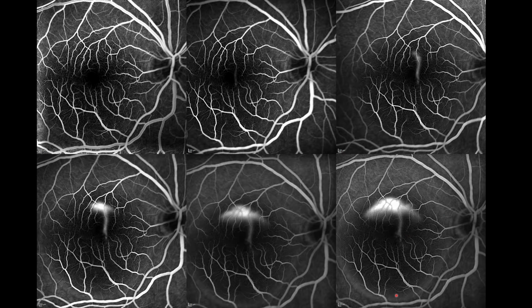Basically CSR, and this is the margin of the serous detachment, and this leak is the cause of the serous detachment. So fluorescein angiography is a dynamic study. We have taken serial images, and by studying the images over time, you can make out the pattern of the abnormality. For example, here we started with a normal looking image, but then something white came up, which kept on increasing in whiteness as well as spread. So we know there is a leak. And then another round area came up, which was increasing in whiteness but not in size. So we know this was an area of pooling.